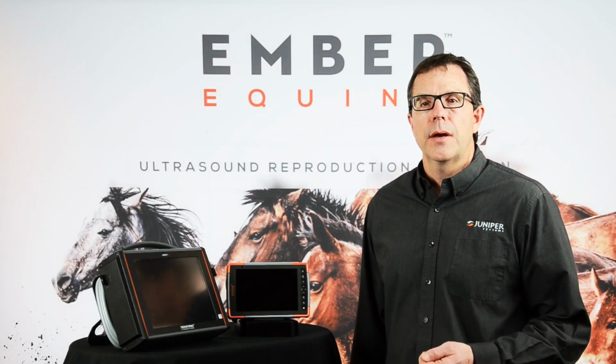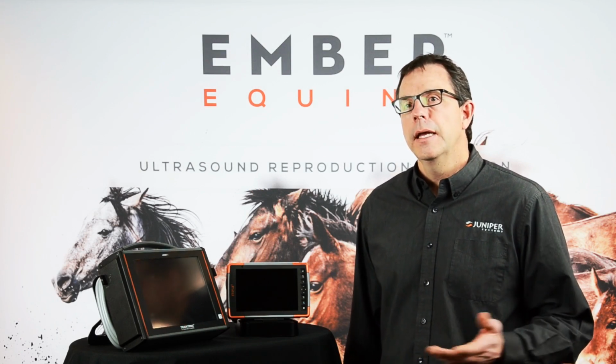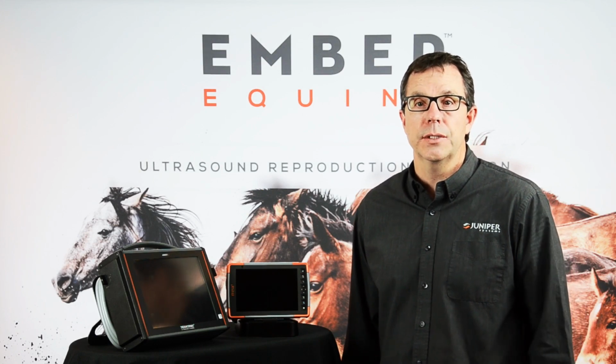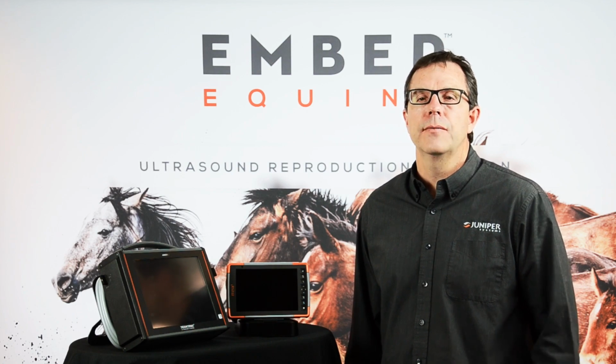The EmberEquine software was designed to be simple, efficient, and user-friendly. In this video, I'll be explaining the basic layout and organization of the software, along with how to customize, perform, and review exams.